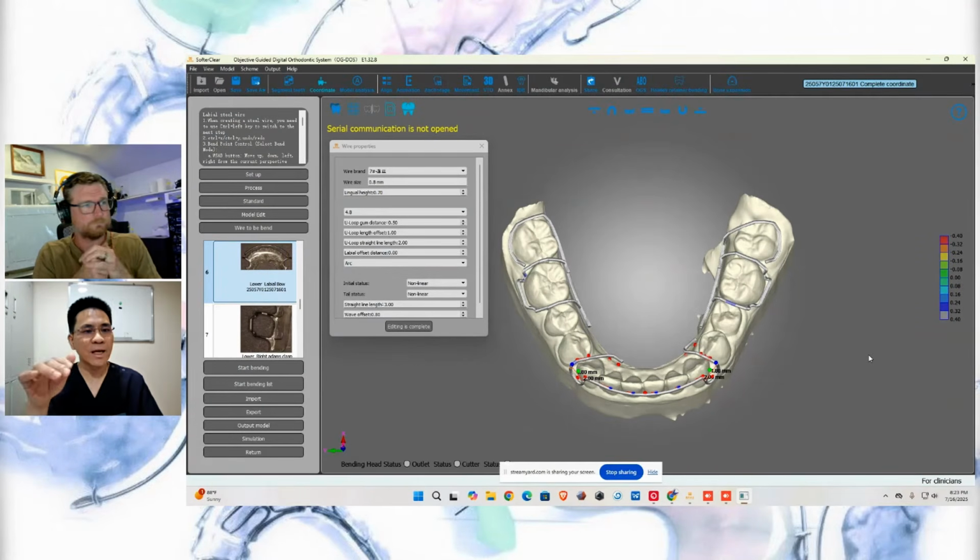Yes, because like we talked about, every bending machine has different characteristics. So what you need to do is just upload the model and what you want to design in the software. Then the ODC will design the wires for you, and when finished, you just download the wires and bend directly. And you can also download the 3D model and directly 3D print. Oh, it'll do the 3D model also.